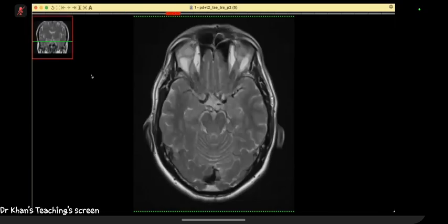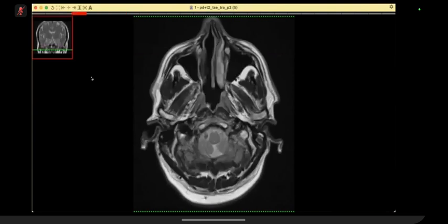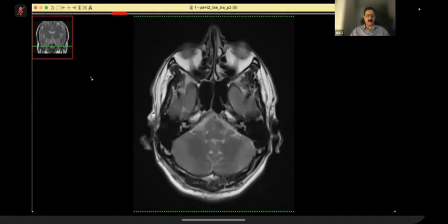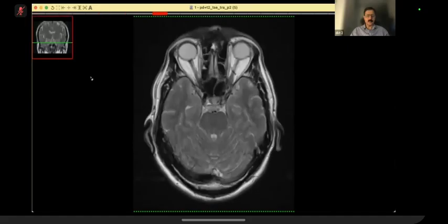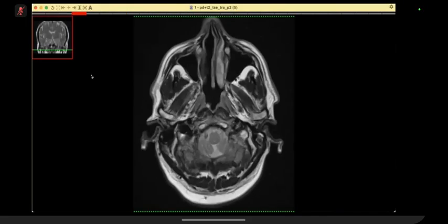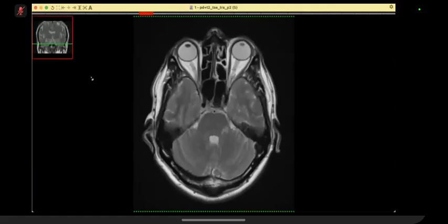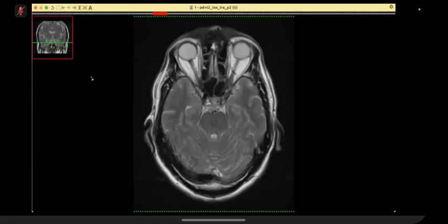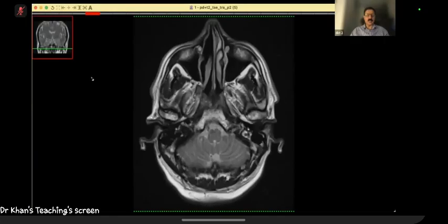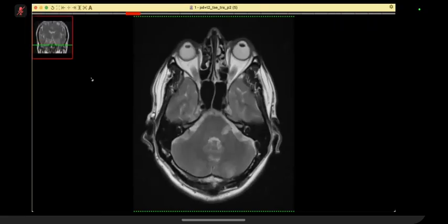Is this patient known to have any? It is an asymptomatic patient, correct? Except for paresthesia. Yeah. Okay. So give me your diagnosis then. It doesn't look extraaxial, intraaxial. Okay, look at the basilar artery. Do you see anything in the basilar artery?